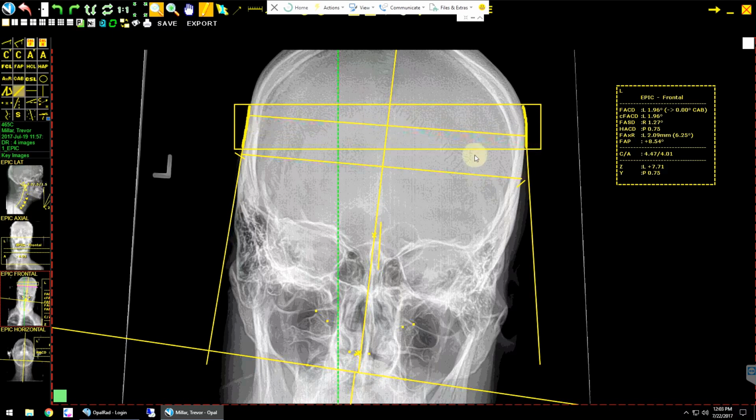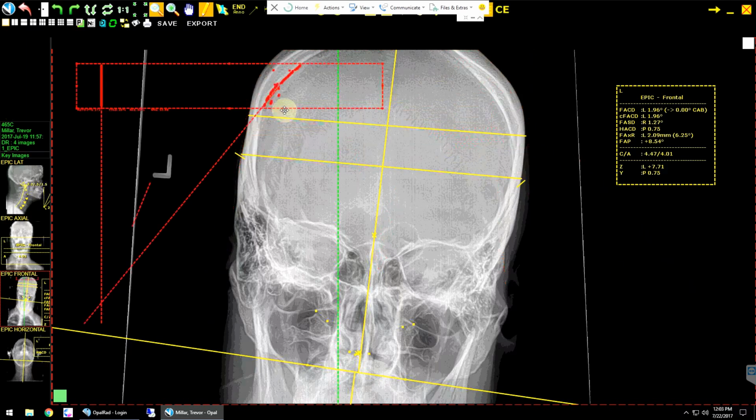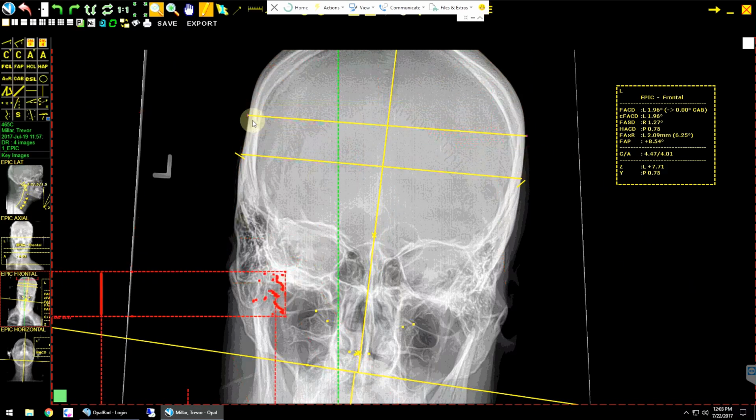So this would be the actual box you'd want to use. I'm going to move that out of the way. So you want to be able to rotate that tool so that now you're actually measuring an inch to inch and a half on the left and an inch to inch and a half on the right, so that you can actually do the real Grostic zoning procedure.